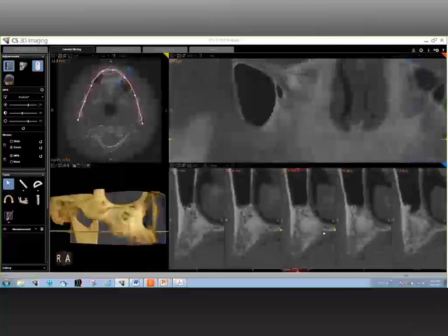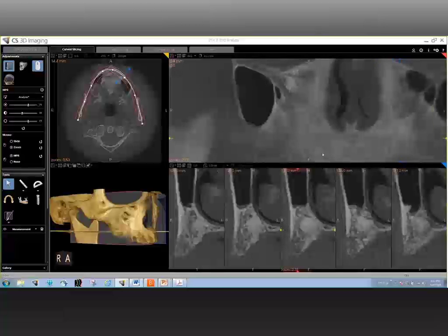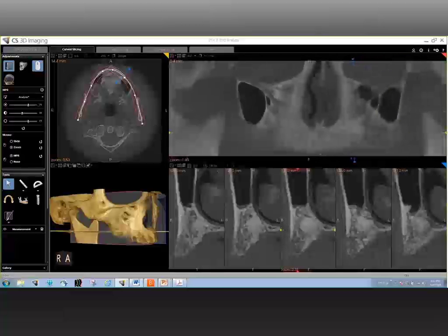So that looks like there was some sort of graft procedure done in that area, possibly a small graft, and it seems like the graft is osseointegrating a little bit. This also shows the importance of having CBCT images for pre- and post-graft procedures, where you can evaluate the area to be grafted, and post-surgically you can evaluate the osseointegration of the graft to the bone by itself. Oh, that's very interesting.